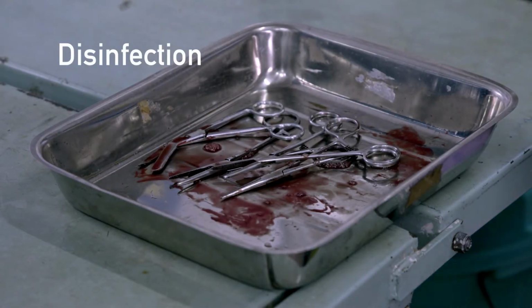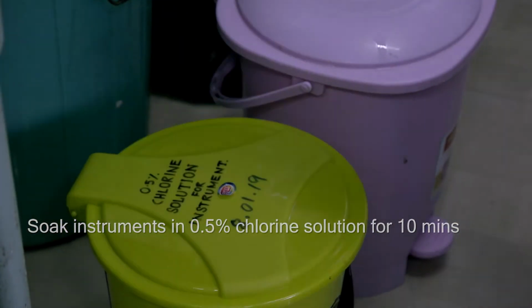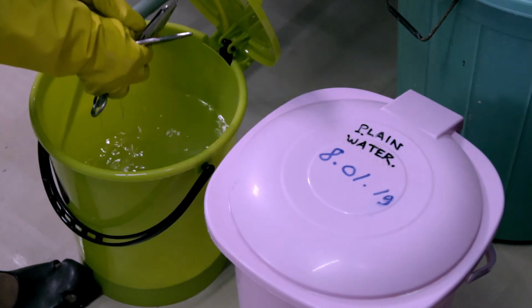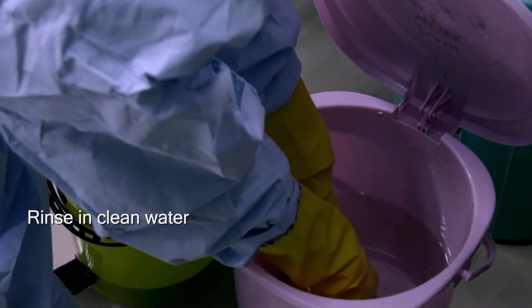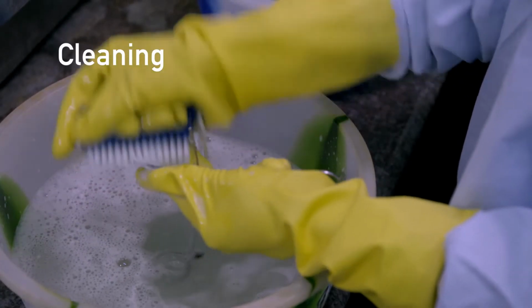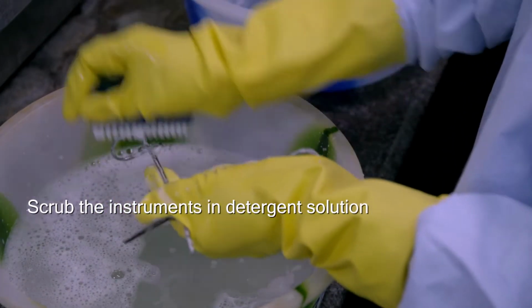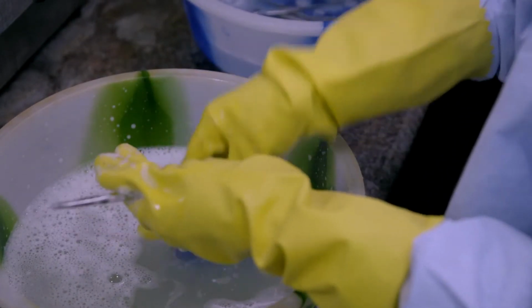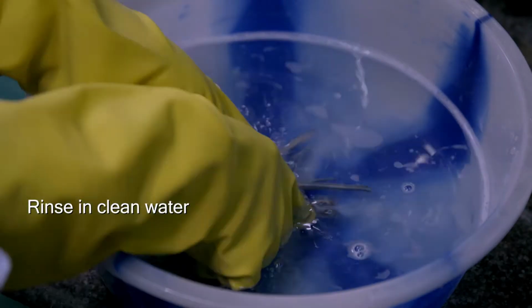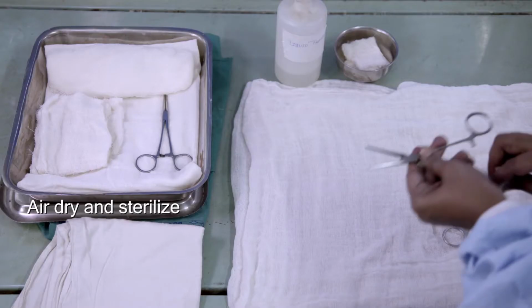Immediately after use, the instruments should be soaked in 0.5% chlorine solution for 10 minutes. After soaking, rinse the instruments and clean them in a container of water. Scrub the instruments using a brush and detergent solution to remove the visible dirt and remnants including bloodstains. Rinse them thoroughly in another bucket of fresh water to remove all the detergent and then air dry and sterilize.